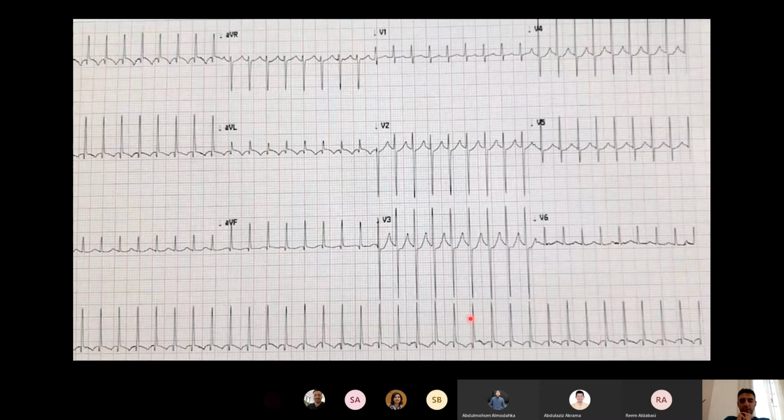Okay. So, for example, this is an ECG where you don't see very clear P waves, right? Do you guys appreciate a nice normal-looking P wave here or no? No. I mean, there are P waves here, but they are difficult to see, and they're probably here at the end, at the tip of the T wave. If anything, they are inverted here in lead one. So this is definitely non-sinus rhythm.